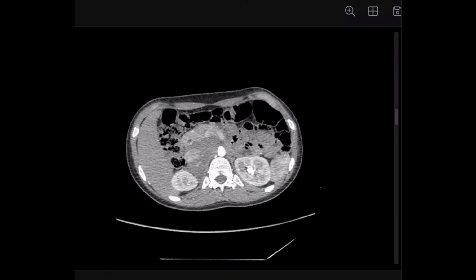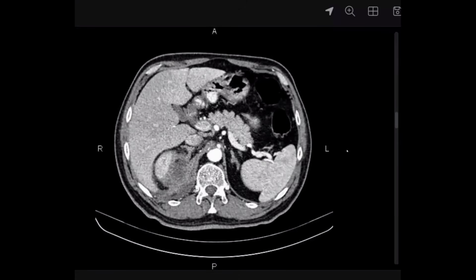Nerve sheath tumors, sympathetic ganglionic tumors, paraganglionic tumors. Okay, this one is considered one of the sympathetic ganglionic tumors. This is ganglioneuroma, biopsy proved. We have three types of sympathetic ganglionic tumor, either neuroblastoma, and I'm unable to scroll it. Okay, thank you.